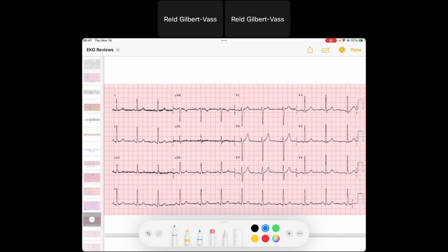So here we've got regular rhythm, narrow QRS, 300, 150, 100, 75, maybe 70 beats per minute. Okay. P waves that are upgoing in lead one, upgoing in AVF. So this is a sinus rhythm. We've got normal PR intervals, so there's no AV block. We've got a QRS that's up in one and also up in AVF, so we know the QRS axis is down to the left, and so that checks out. We've got R wave progression that is appropriate in the precordial leads. We have a QT interval that's normal, and so this is a normal sinus rhythm.